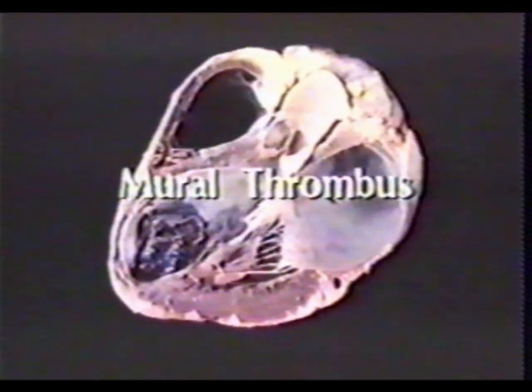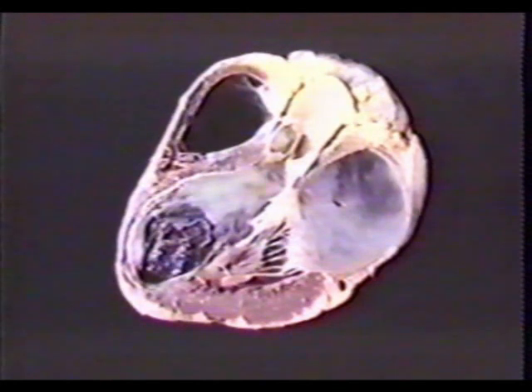We have already illustrated chronic mural thrombi that had formed in apical and infrabasal aneurysms. This is a specimen from a patient with an anteroseptal apical infarct. Note the thinning of the septum and of the anteroapical segment. A large thrombus protrudes from the apex into the left ventricular cavity.